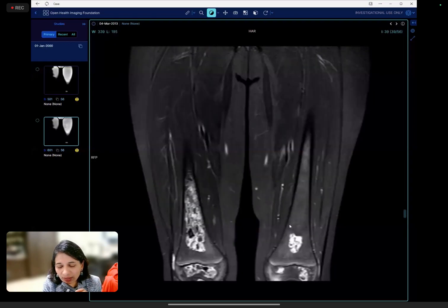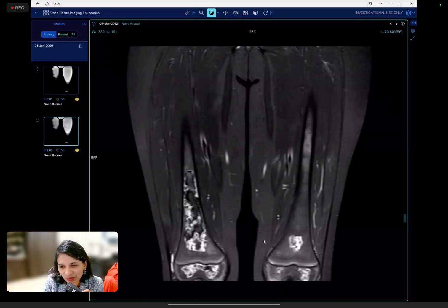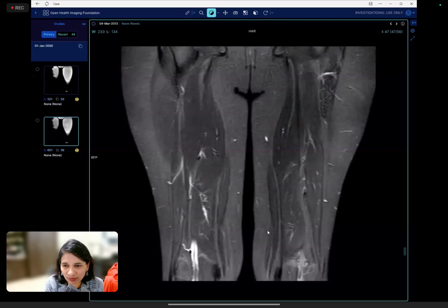One observation for you would be, please ask for the other views. Please ask to scroll through the full set of images, because you may otherwise miss something. That will be one of the take-homes for you. Don't hesitate, ask, because that's what you will do in normal practice, isn't it? You will go through all the images and you'll ask for further views.